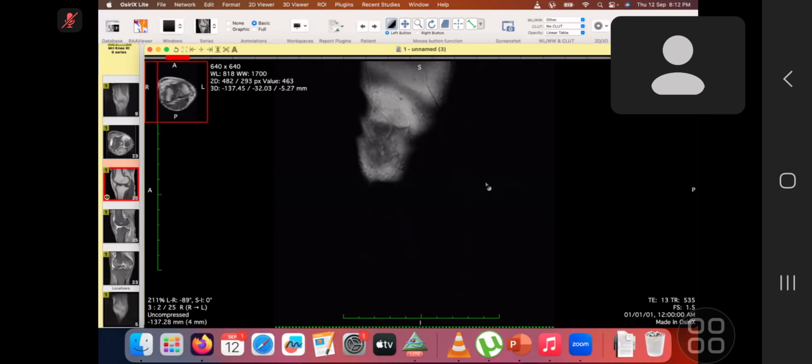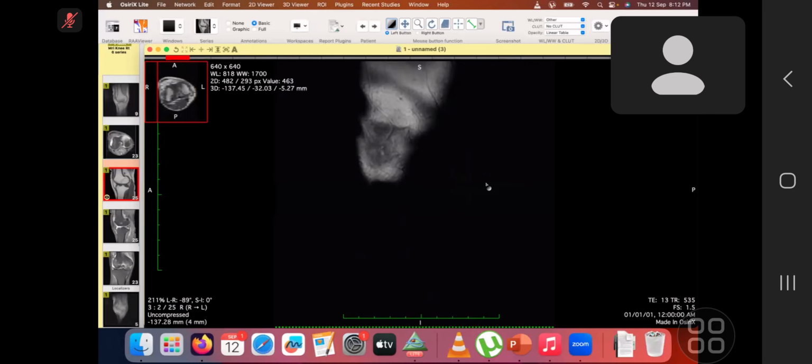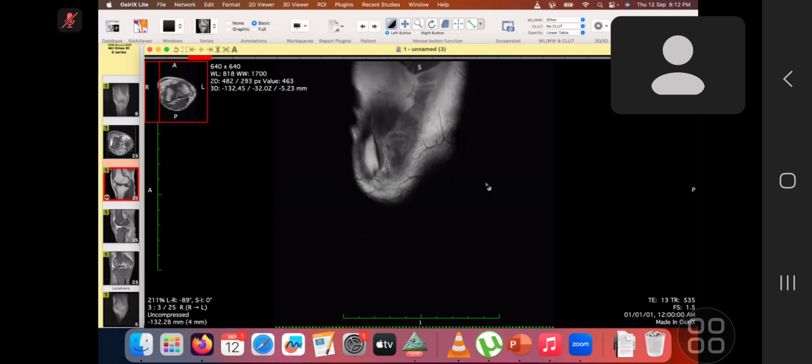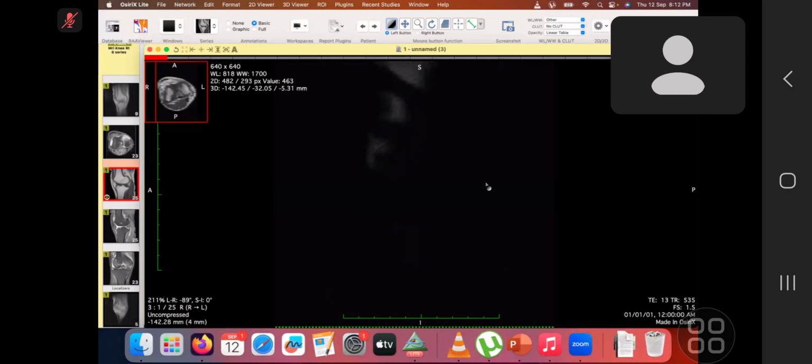So in summary, I'm presented with a case of ACL tear, a medial collateral injury, and lateral patellar dislocation or subluxation.